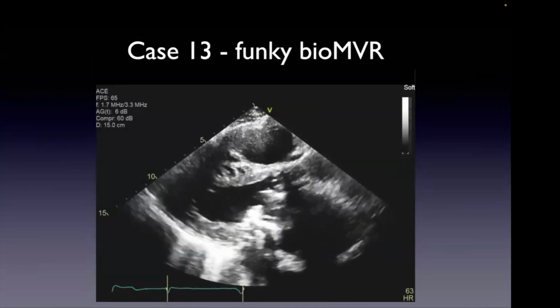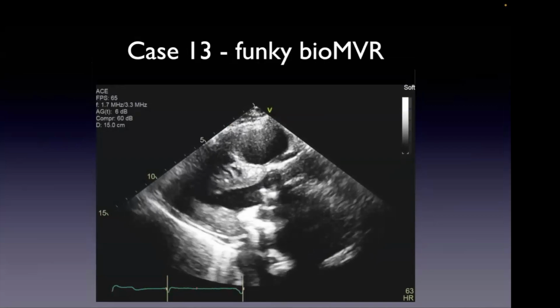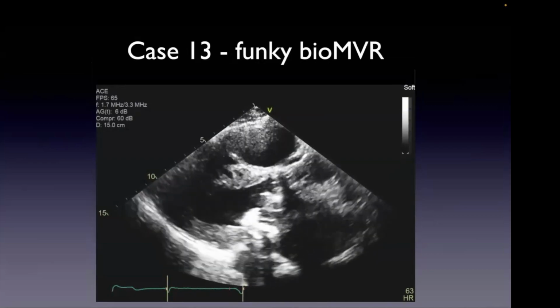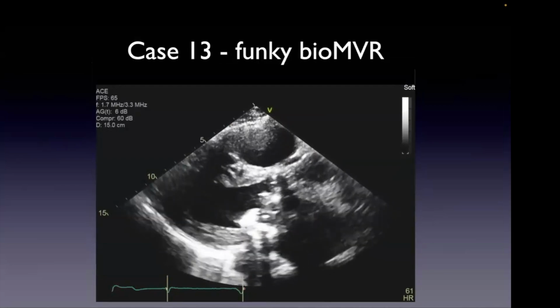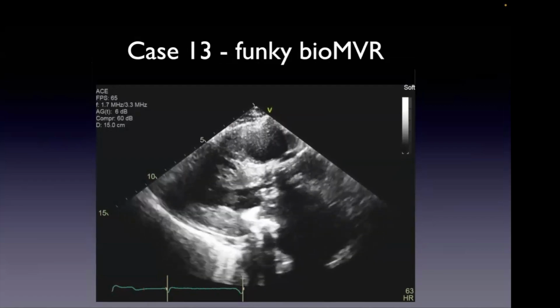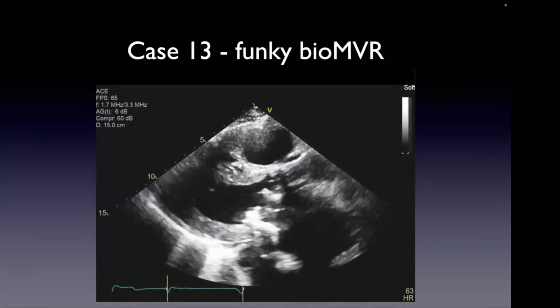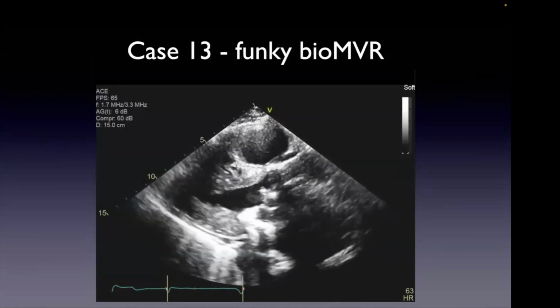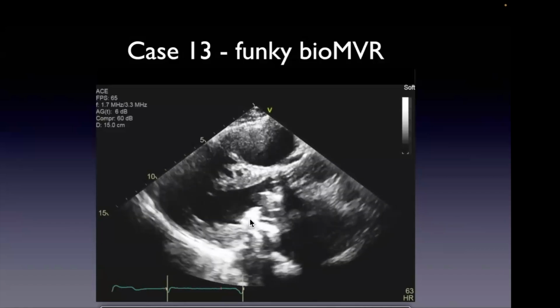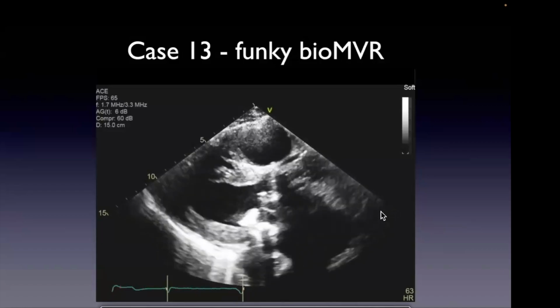When I saw this, I was like, what the heck is that? What's the unusual thing about this particular image? Well, you probably know this case. But you're looking at this, right? Okay, we'll come to that later, but that's not the abnormality I'm looking at. The leaflets. Yeah, what's up with the leaflets?